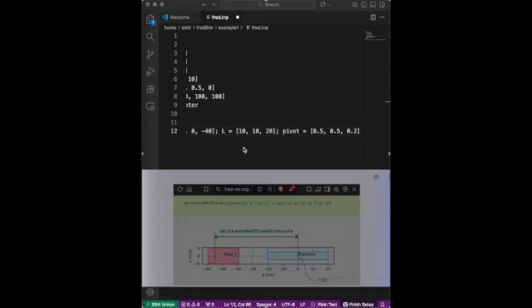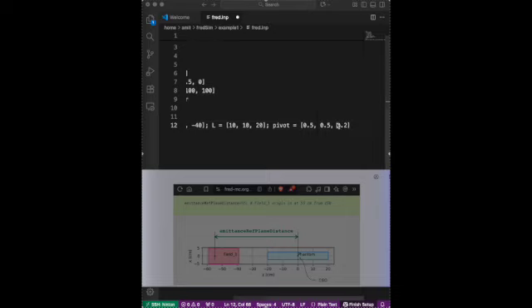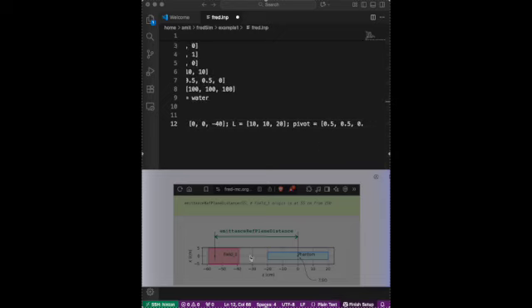For example, my field box starts at minus 40. So at minus 40, the 20% of minus 40 would be how much? 8. So minus 40, I mean, it goes inside, like 20% from the inside. So it's minus 40 minus 8.